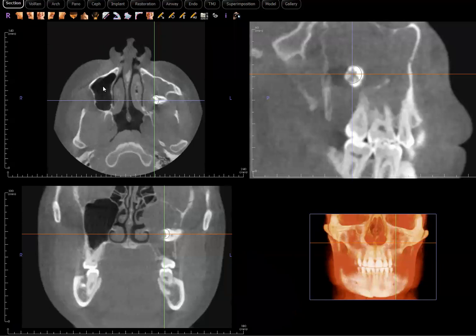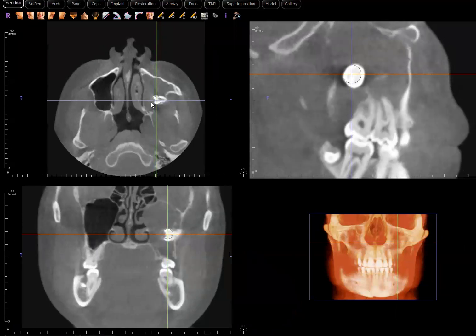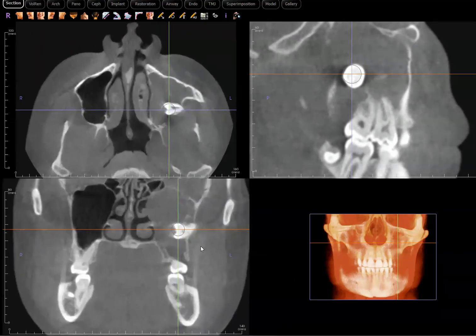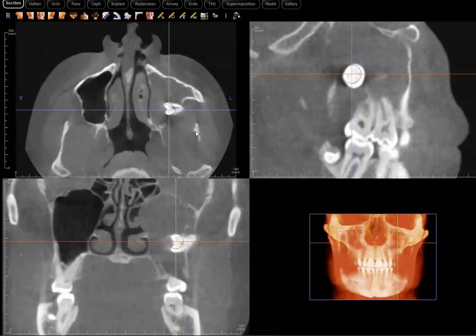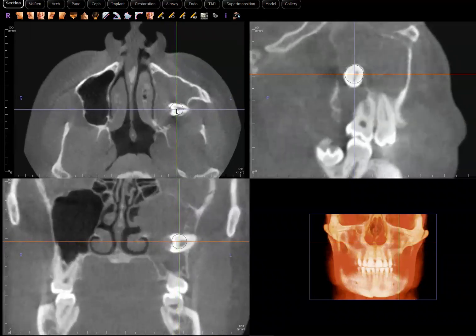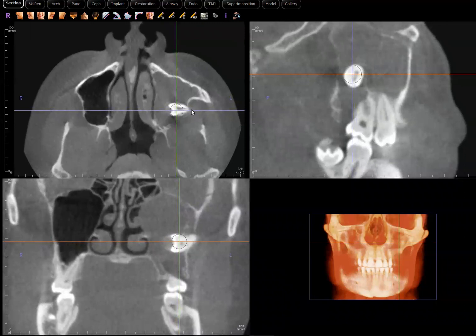Now let's go ahead and take a look at that. As we already identified from the panoramic view that this wasn't positioned upright, tooth number 16 is indeed positioned horizontally, but in a way that the occlusal plane is facing mesially, or medially, excuse me, rather than buccally. Or you could say it's facing palatally as well. That's very interesting, right? And again, let's look at the axial.